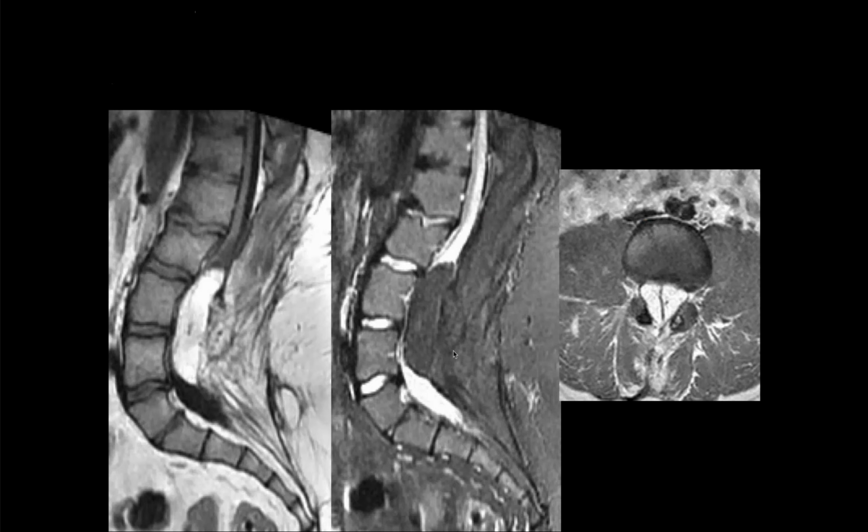This is actually a true T2, which you never see anymore. This is not a fast spin T2. If you have a true T2, the fat's not bright. The bright fat is an artifact of the fast spin technique when you do T2s with fast spin. So you won't see this kind of study because they take a very long time, like 20 minutes to do. But in the old days, that's all we had. And this is just a lipoma.